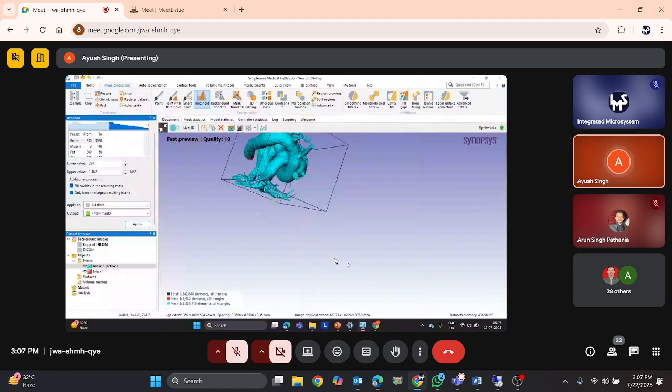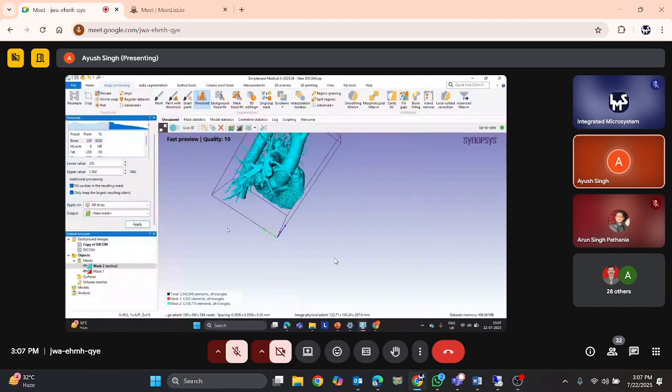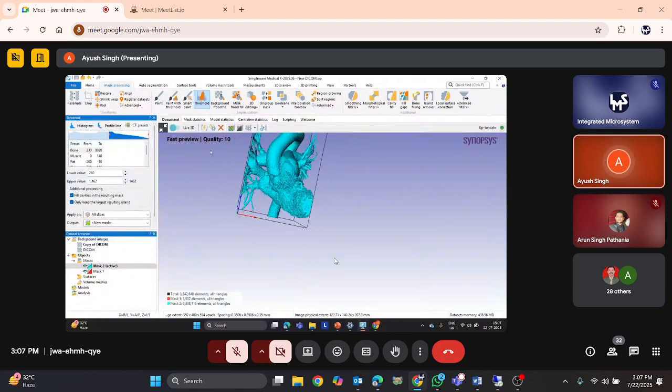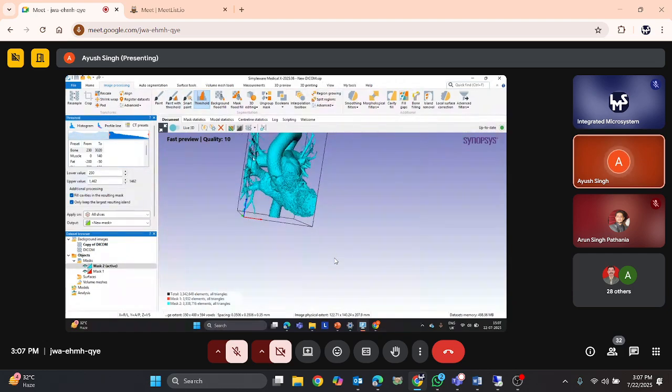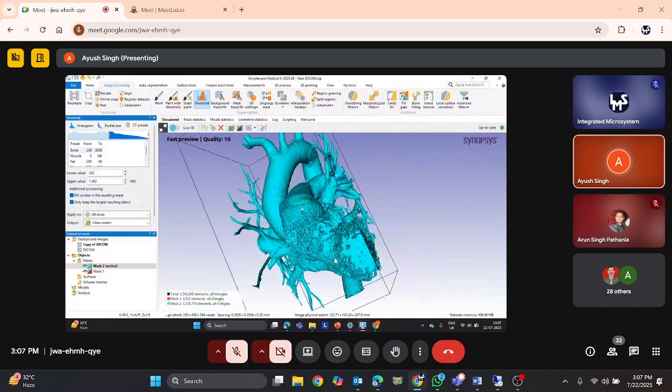But still, if someone wants to work on the aorta, he can easily identify this and distinguish it from the rest of the structure. So this way, it has driven down the time of computation by a significant margin. But it is still a time-taking process because it has only done the initial splitting. Now, what we need to do is split out those particular parts into different regions.